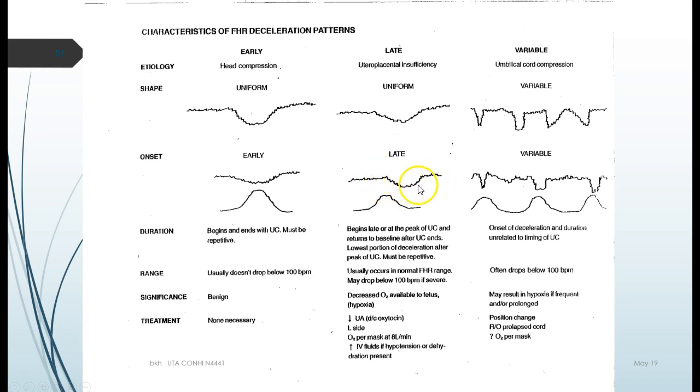Our baby, who is compromised, decompensates and drops their heart rate. Here's the end of that contraction. It does not return to baseline until well after that contraction. We've got to get blood flow back through that placenta that's not working well.